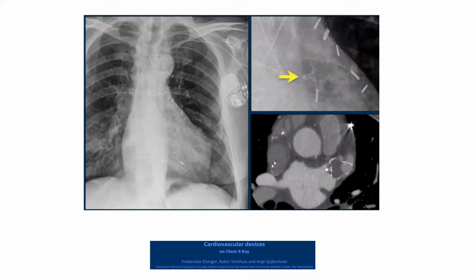But I want you to focus here. This part, which is zoomed in here. So what is this? What is this structure here? You remember we said this part of the border is occupied by the pulmonary and the LA appendage.